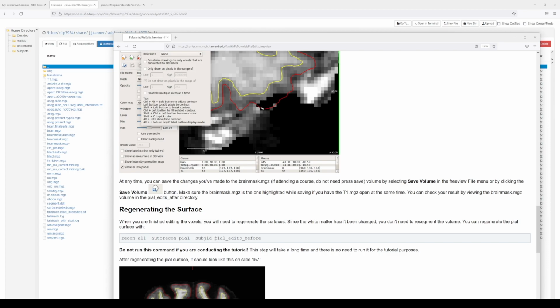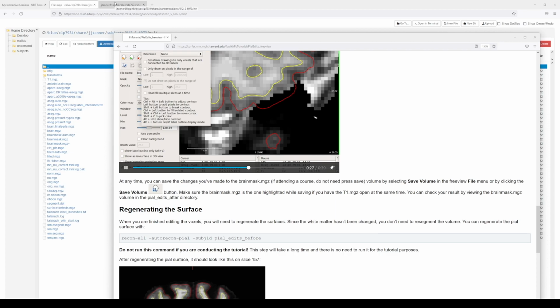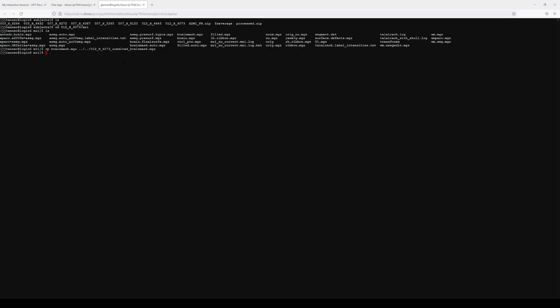So let me show you a way to run this so you don't necessarily have to run a whole script. That's what I recommend, but there is a way to do an interactive sort of session. The downside to this is you would need to keep your window open for it, meaning if you close out of this, it might end the session, which is why I don't recommend it. But if your computer's stable and you don't think it's going to crash, it shouldn't necessarily cause a problem if the window closed, but it's safer to do the whole script and do an sbatch and submit.